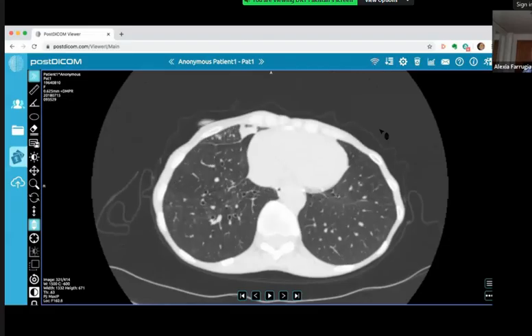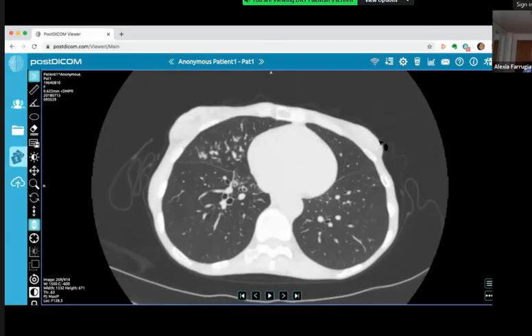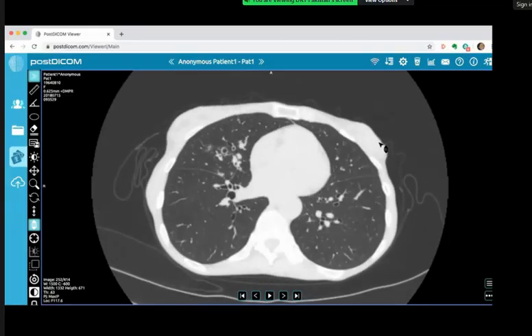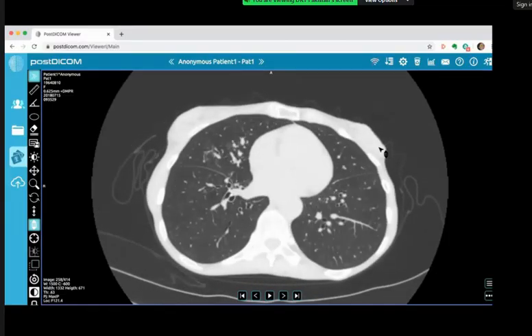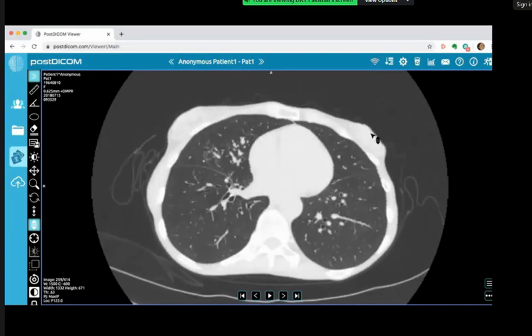So in an elderly female, is there anything in particular? Yeah, so the changes in the middle lobe, the bronchial wall dilatation, mucus plugging, and possible tree-in-bud nodularity in an elderly female would make me think of Lady Windermere syndrome, as opposed to TB, a TB pattern. Okay.